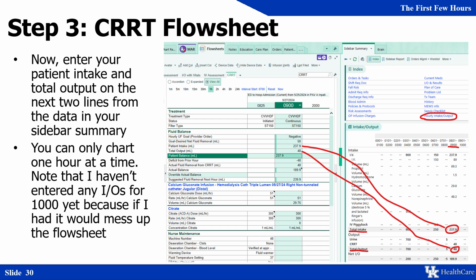So as you can see, this patient was on D5LR in the ED, but that is no longer running, so it's okay that we have that double dash. But if that were, say, her norepinephrine or her propofol or something that we know is still running, this would be our time to say, hey, wait, I know that I forgot to enter a value. Let me actually clear this out and go back to my INOW flow sheet and fix it.